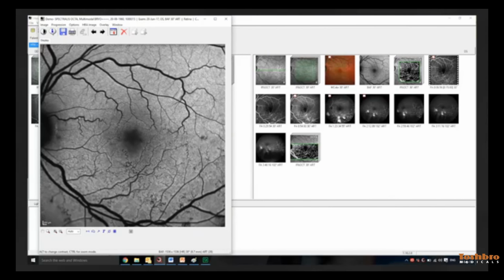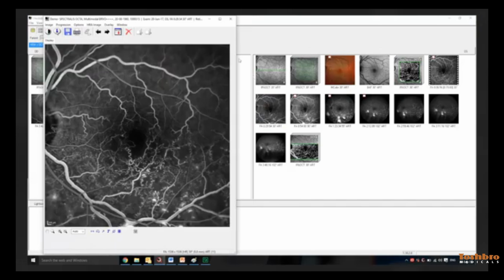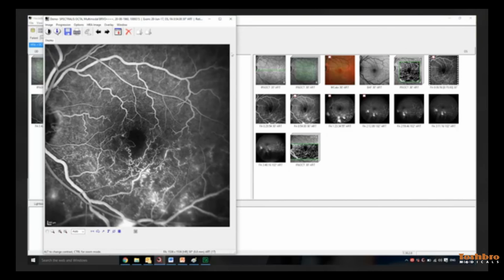Blue peak autofluorescence is also complementary and may give information about atrophy or pseudoreticular drusen. Conventional dye-based angiography is particularly useful to give information about the blood-retinal barrier. Breakdown of the blood-retinal barrier is identified on fluorescein angiography through leakage, but OCTA does not identify leakage.